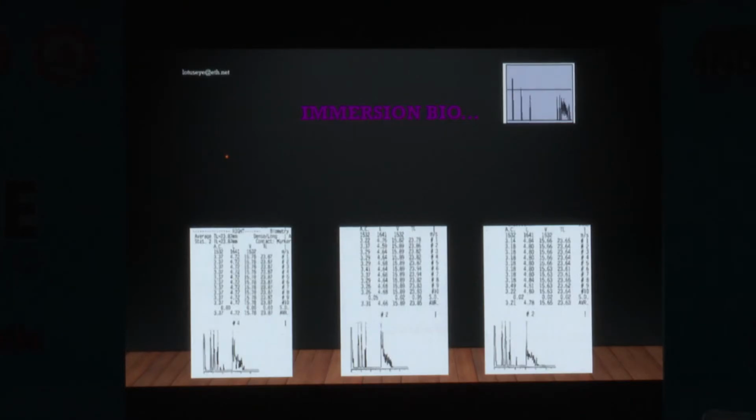Then, paying some attention to the spikes of the A scan, if you look at the 3 scans, the axial length is 23.87 in the first, and 23.85 in the second picture. This is the axial length of the same patient, done by 3 different optometrists. So the first 2 readings are okay. Third reading, what is the axial length? 23.63. So same patient, there is a difference.